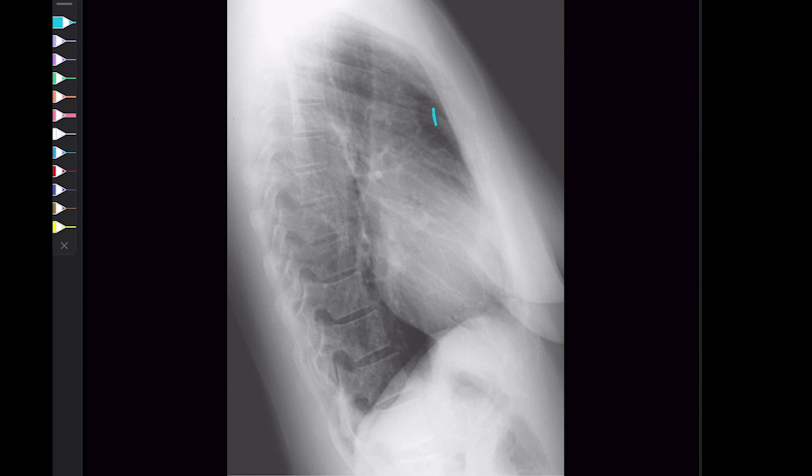This is my area number 1. And what is that? We call it the retrosternal area. You can see this outlines. So this retrosternal area has to be clear. The second point, there you can see the hilar region.